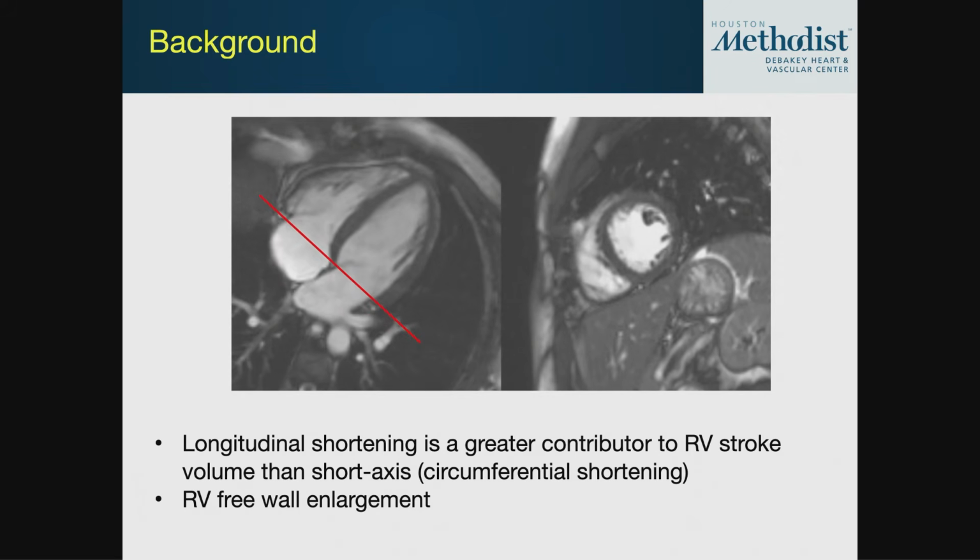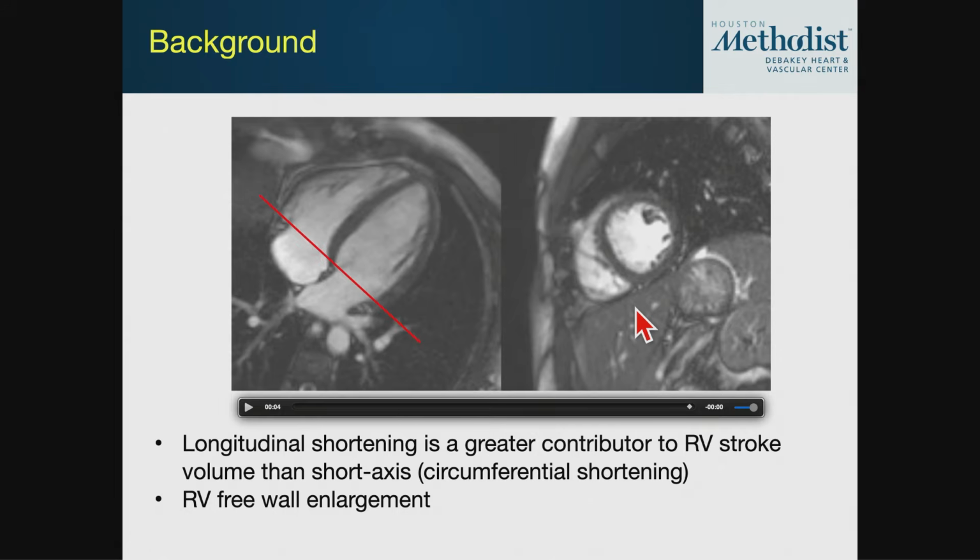And that's in patients who have Ebstein's anomaly, where you have a very elongated tricuspid valve. And in those cases, the short axis views may be very misleading because you need to really identify what's the atrialized part of the ventricle, or what's atrium and what's ventricle, and those leaflets can make it very difficult. So there's a specific scenario where you will do a long axis stack, but most of those are going to be the congenital patients.